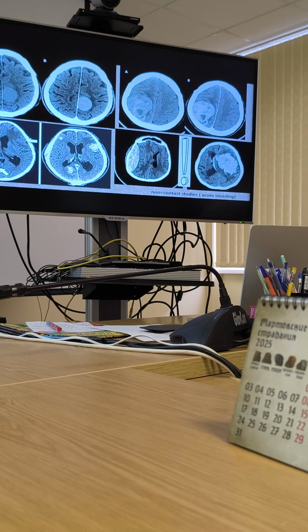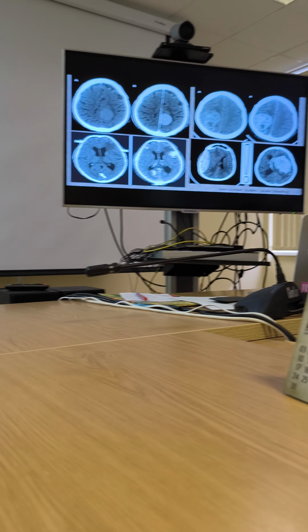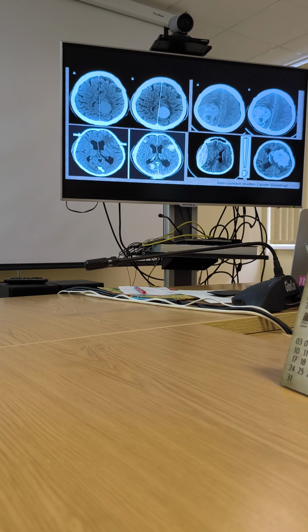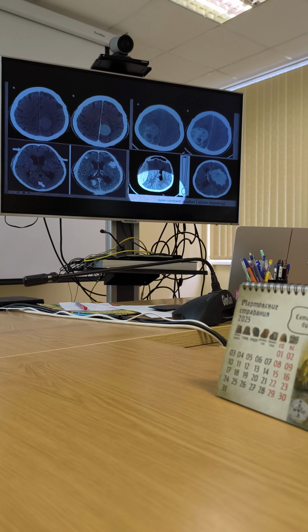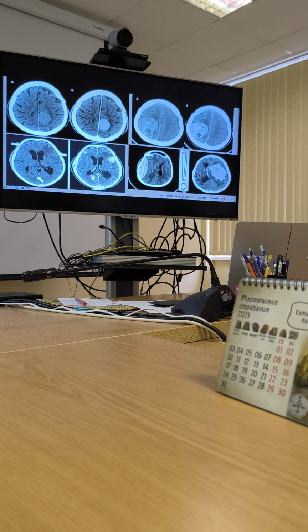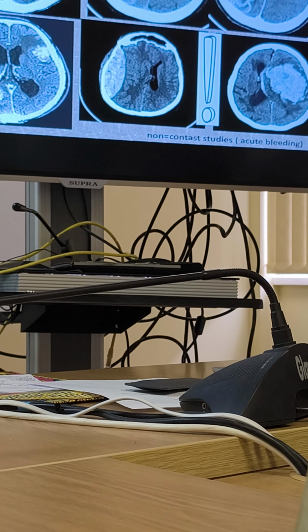What is also important is that basically we like enhancing images and enhanced pictures, because they're helpful, and they are like turning the light on. But in some situations, they are not the right choice. For example, if you look at these two pictures, at first you say, okay, this is also something which is enhancing. But these are situations which are completely different. These are pictures without enhancement. These are non-contrast enhanced pictures.